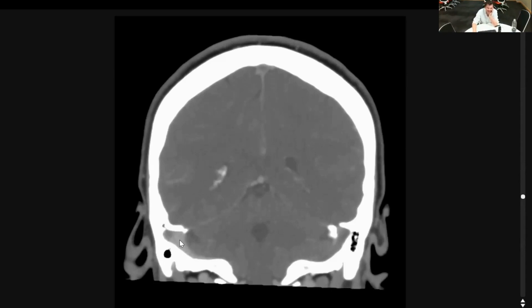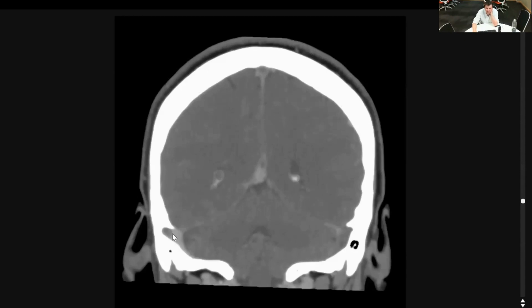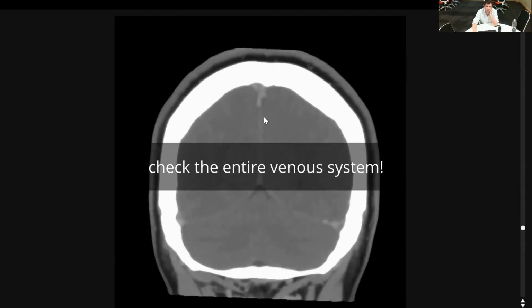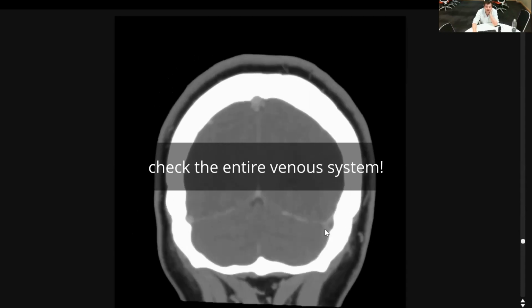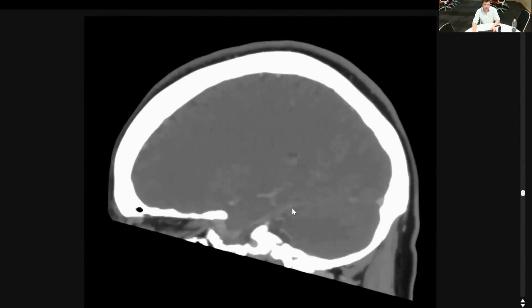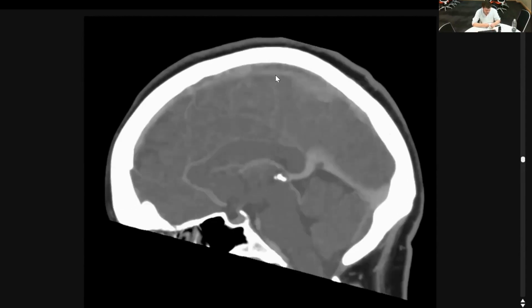Go for it, yeah. The other thing to have a look at is, if you've got a clot somewhere, always check all the other veins. Because if you look over here, there's no contrast on this side. So they've got clot on that side. And if you look right up the superior sagittal sinus, this patient's got clot up here as well. So this is a young 45-year-old patient with extensive venous sinus thrombosis, and they've got a bleed as well. So what we normally do with patients who have got deep sinus venous thromboses, what's the treatment?